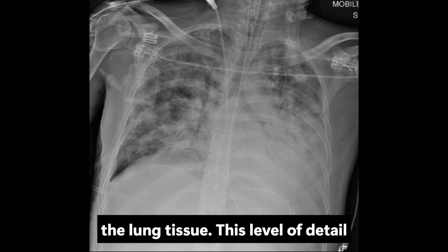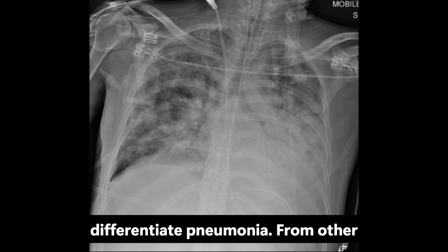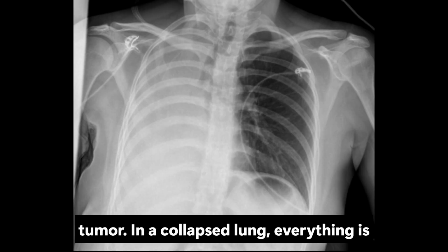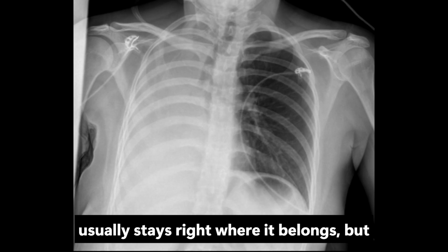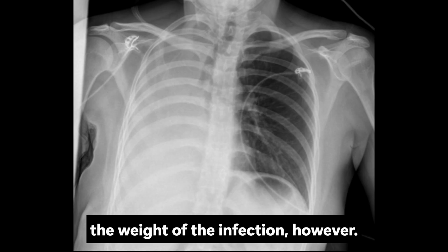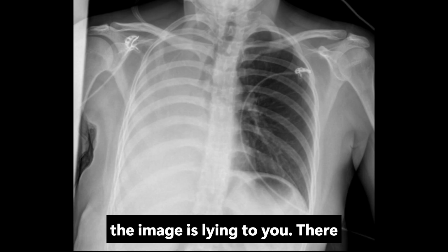This level of detail is vital because it helps us differentiate pneumonia from other issues, like a collapsed lung or a tumor. In a collapsed lung, everything is pulled together, shifting the heart and the trachea. In pneumonia, the anatomy usually stays right where it belongs, but the air is simply gone, replaced by the weight of the infection. However, being a professional means knowing when the image is lying to you.